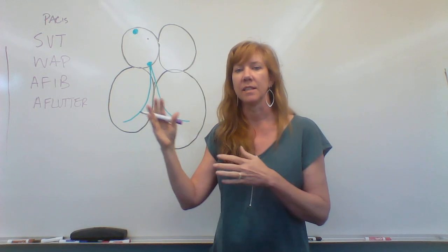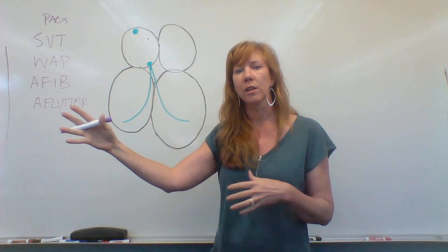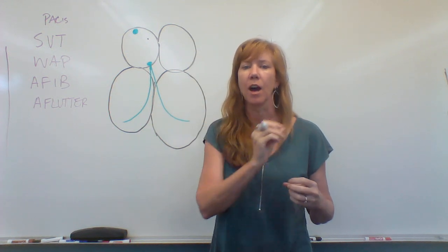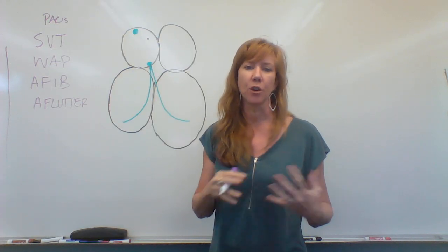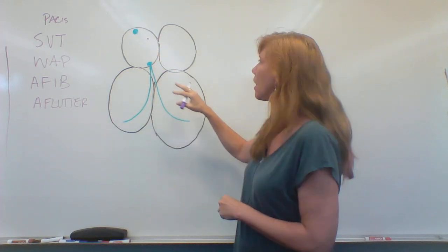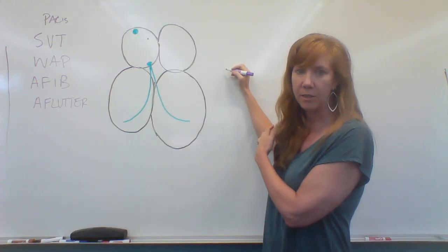And that's when we see an uneven rhythm on the heart monitor. They're going along mostly in sinus rhythm, but every now and then they just have one or a couplet of these extra beats. A premature complex of some sort. Right now we're talking about premature atrial complexes coming from the atria. So what would they look like? Well, you've got people going along in sinus rhythm.